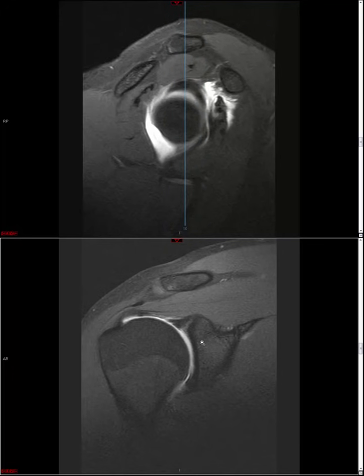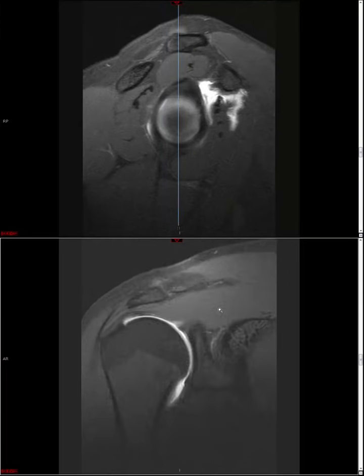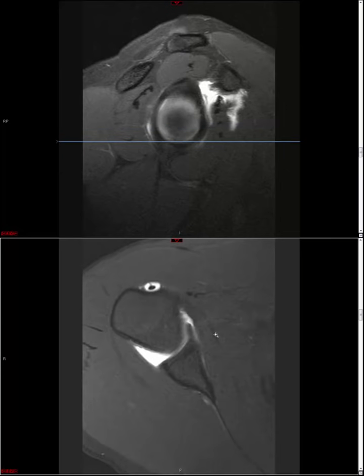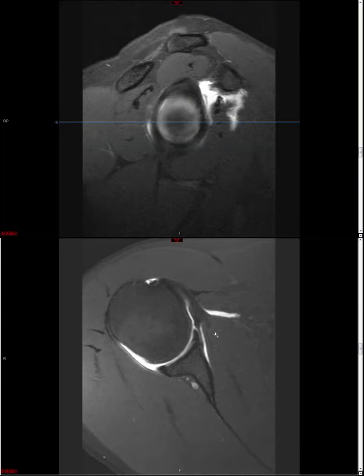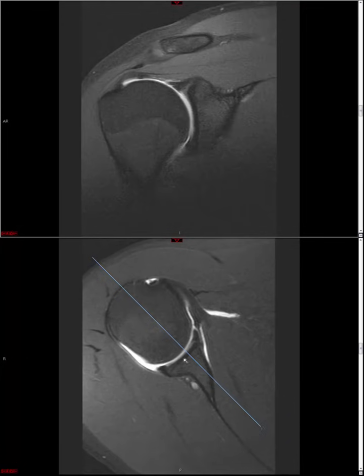All right. So just like in the knee meniscus, we basically go through the entire labrum on our axials and coronals, and we note the tears as we see them, being mindful of these pitfall normal variants. If you do see a labral tear, then just like in the setting of a meniscal tear, it's helpful to see if there is a paralabral cyst, and if there is a paralabral cyst, it's also helpful to note if it extends into the suprascapular or spinoglenoid notch.